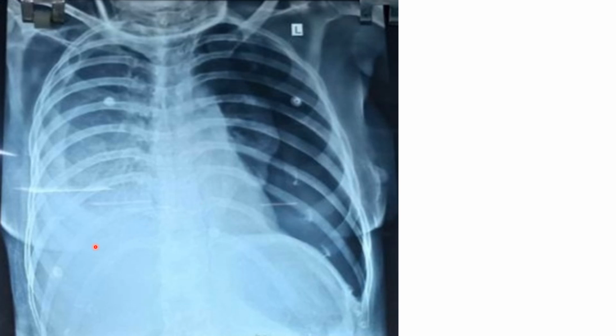In this X-ray, on the right side, you have pleural effusion. So this is a partially collapsed lung. You can see this lung margin. The CPA angle, costophrenic and cardiophrenic angles are obliterated, and then you have fluid here, up here. So fluid is there, a right-sided pleural effusion.